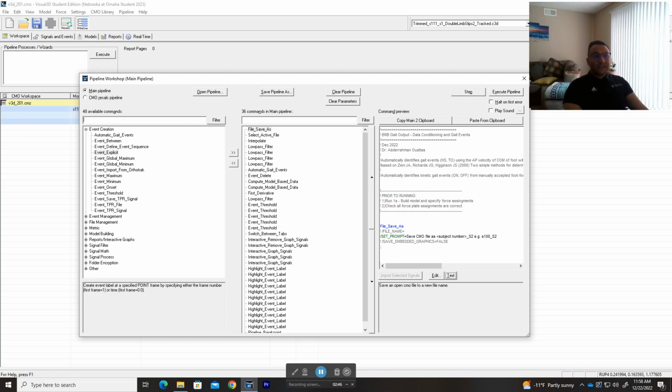Obviously, it's not as open and free, not in terms of open access meaning that anyone can use it, but in terms of being able to do anything you want with it, like MATLAB, for example. In MATLAB you can write any code you want and make anything you want, really, but here it's a little bit limited compared to MATLAB, but it's still a very powerful tool to complete and run biomechanical analyses.